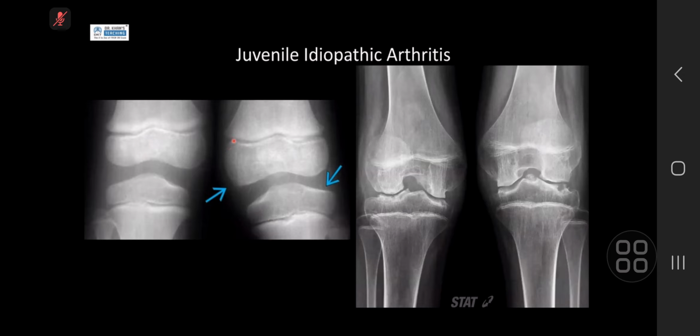In this patient, both legs, one is more affected with arthritis on the left and not on the right. You can see the epiphysis is a lot bigger on the distal femur, and the epiphysis as well. And then this is one that has bilateral JIA involvement of both knees, and you can see that widening of the intercondylar notch. To be fair, if you are looking at symmetrical findings on both sides without one to compare, then in the absence of other symptoms and a purely isolated widened intercondylar notch, I think it's hard to pick up. I often have to go back to compare it with age-matched controls to say, is it truly widened or is it just a projection thing?